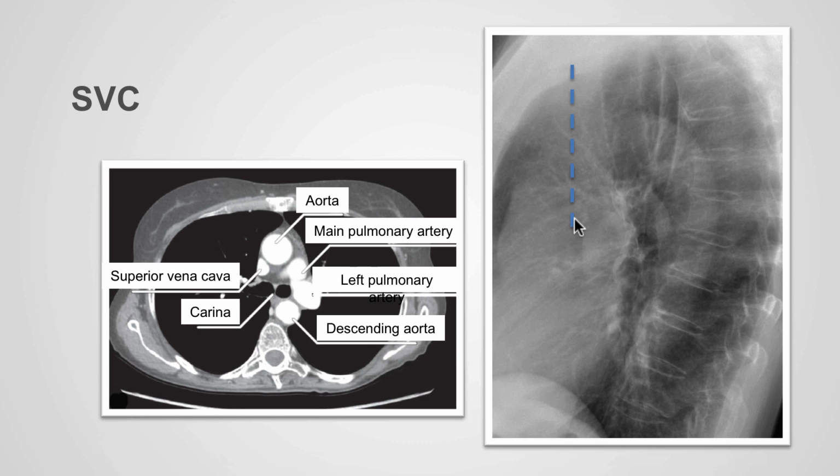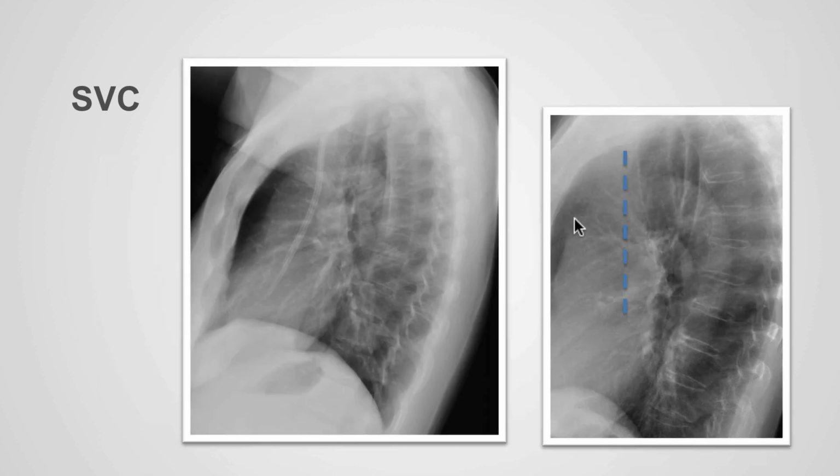these structures. Here is an example of a central line that has been placed into the right atrium. The course of this line is anterior to the trachea and anterior to the right pulmonary artery, and we can confirm that the position on the lateral X-ray is normal.